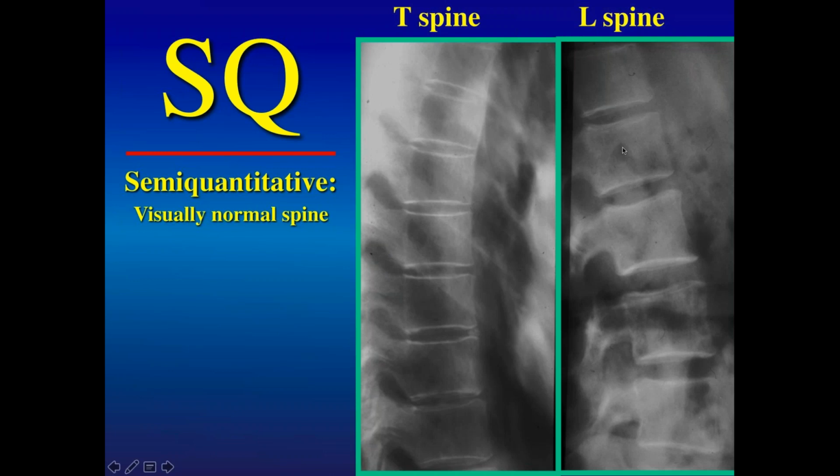Here we see similarly in the lumbar spine a self-similarity in the appearance from one level to the next, with a gradual change in the configuration as you go inferiorly. Typically the lower lumbar levels, L4 and L5, are posteriorly wedged, which helps to account for the lumbar lordosis, which is a normal configuration.